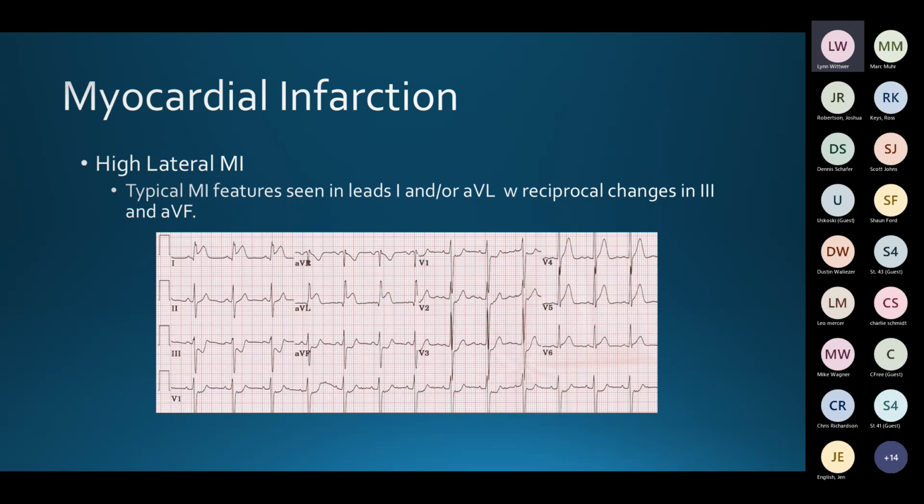Usual etiology of ST elevation in AVR is repolarization abnormalities, hypokalemia, digitalis toxicity, shock and sepsis, hemorrhage, dissection, sometimes a PE that may indicate some right heart strain. And acute coronary occlusion is only less than 10%. So odds are you may never see one, but call it if you see it and call it to the attention of the doc. That's one more piece of evidence that this is an acute problem, needs to be dealt with.